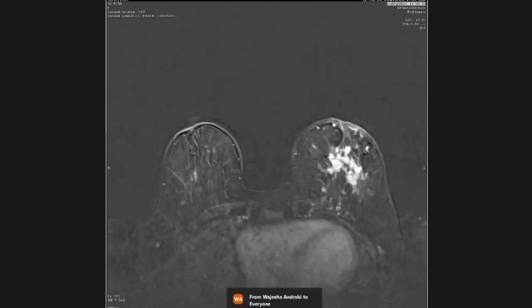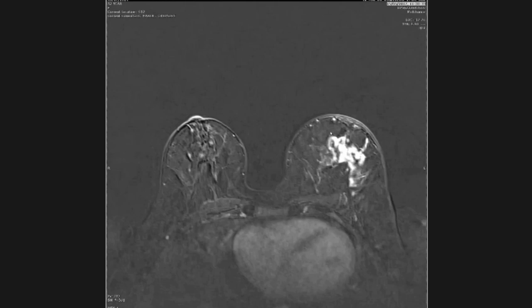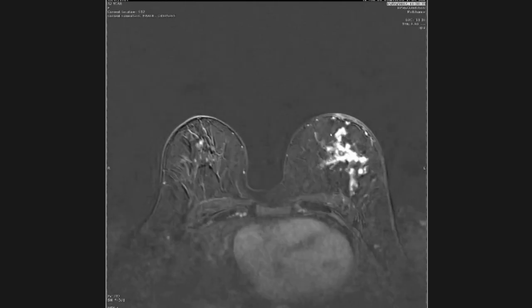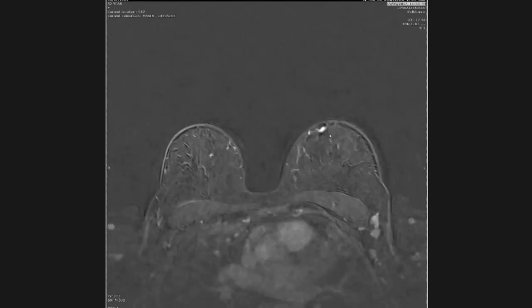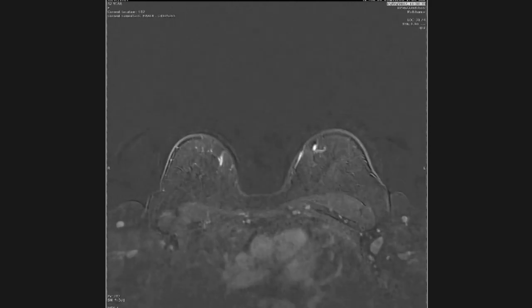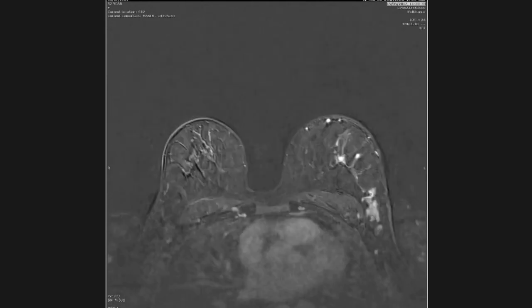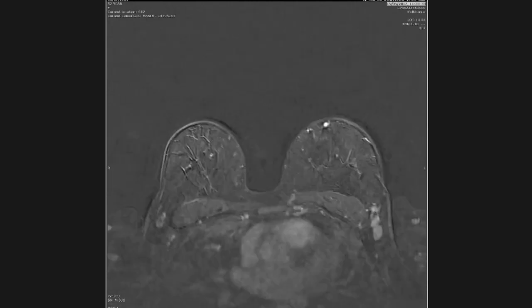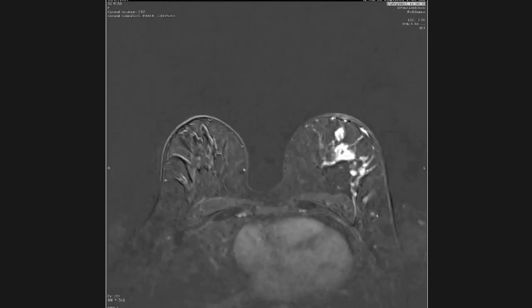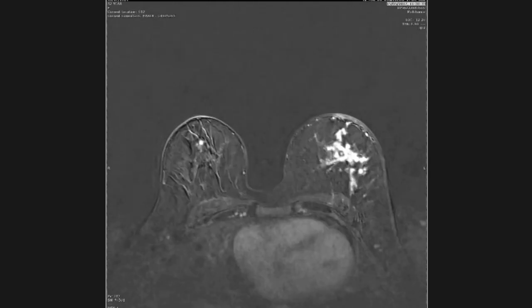This is the lower quadrant lesion, lower down, which we'll be talking about, with spiculated margins and with the coarse trabecular pattern and overlying skin thickening and enlarged axillary lymph node. I think there appears to be another lesion close to the axillary tail, which shows spiculated margins. So that might be suggestive of some multicentric carcinoma in this patient. Yeah, it almost looks confluent. If you look at it, you've got your axilla there, then you've got this lesion here, and it all pretty much appears confluent with the main mass.